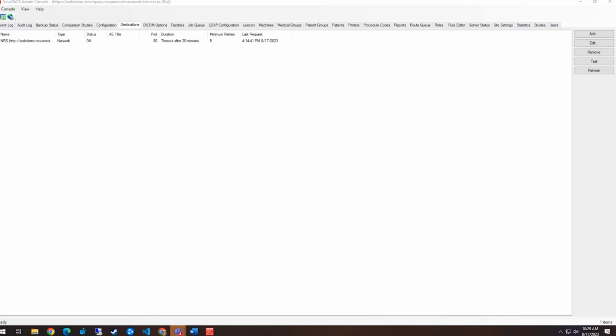All right, so I'm going to start talking about the destinations tab. And just so you guys know, the version that we're currently demoing on is 8.9. We changed our route rules, things like that in 8.8. So if things don't look familiar, you may not be on that version yet.